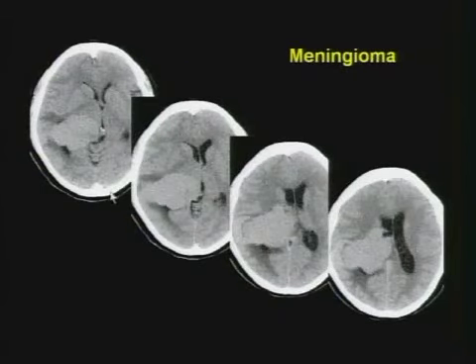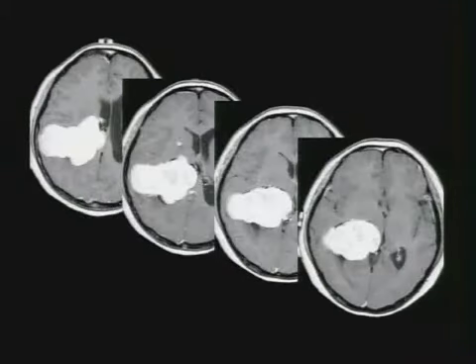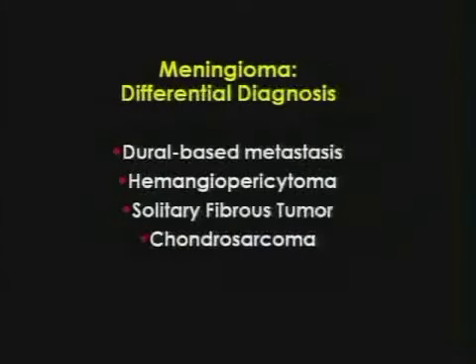Meningiomas on non-contrast CT or MR can be very difficult to outline because they tend to have a similar consistency as the brain. So here's a huge atrial meningioma that almost has a similar density as the adjacent brain. Here's an MR of the same patient, pre-contrast T1, showing you fairly homogeneously isointense signal to the adjacent gray matter. Very characteristic of meningioma. Upon giving contrast, it avidly enhances. T2, same thing. Very similar signal characteristic as the adjacent cortical gray matter. But almost all of them avidly enhance.